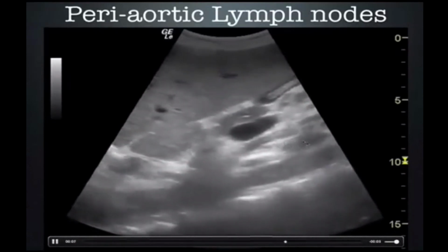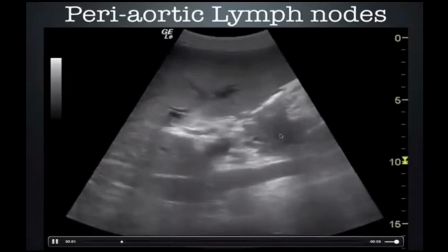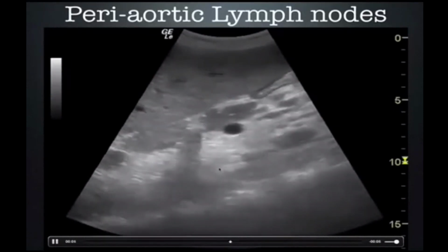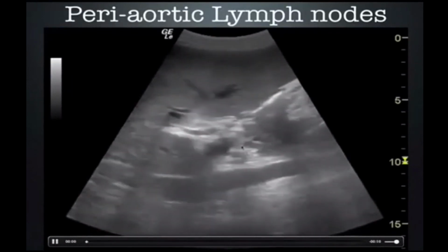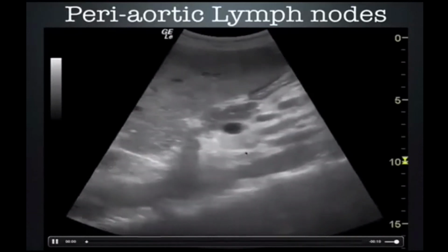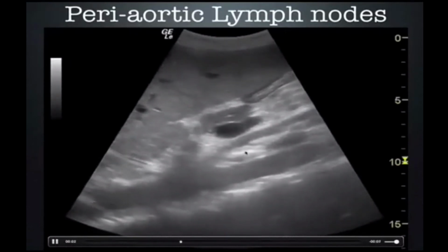And a lot of times when you look at peri-aortic lymph nodes, you can see a lymph node squeezed between the SMA and the aorta, and oftentimes it'll even affect the trajectory of the SMA, giving, rather than kind of an oblique takeoff, giving almost a vertical takeoff. As the lymph nodes grow, it actually pushes that superior mesenteric artery into more of a vertical trajectory.